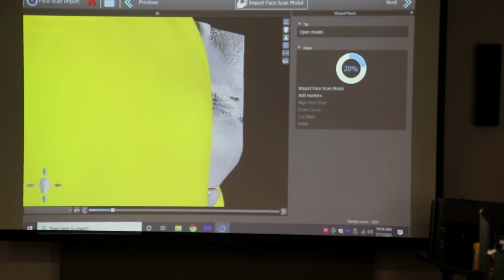So now it's importing both of them, and sometimes it aligns it, sometimes it doesn't. I see. So the next step is you're going to move it in, align them. I got you. And usually just click OK. It doesn't really matter.